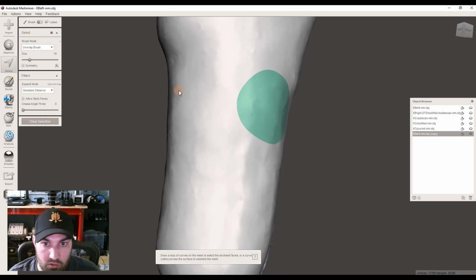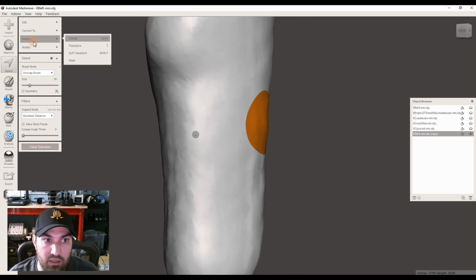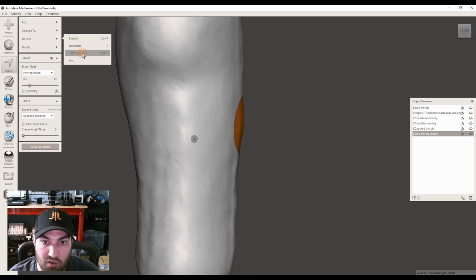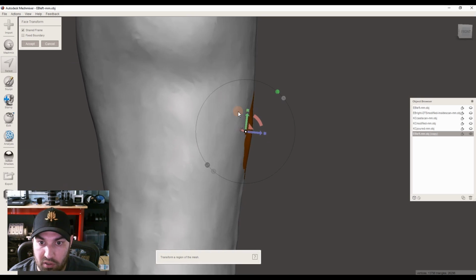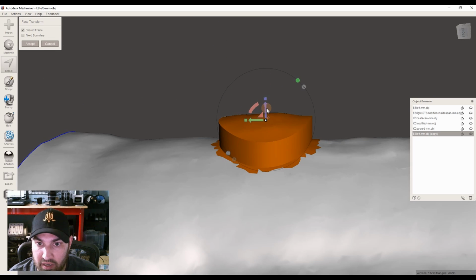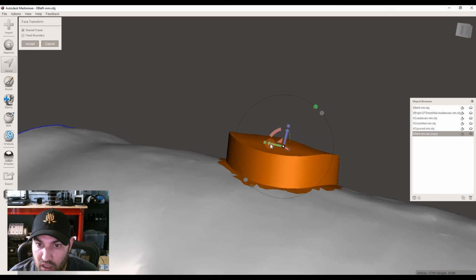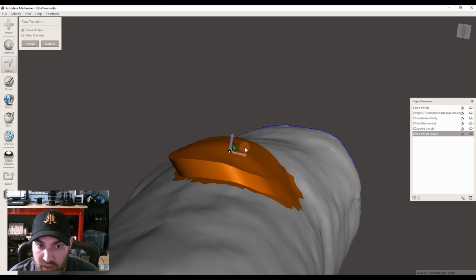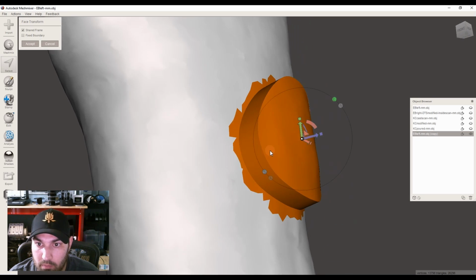is what's called soft transform. So if we select that area, deform, and soft transform, that's going to be, well, let me show you transform first. So transform is basically like an extrusion without any sort of measurement to it. So you can pull it. What you can do though is have more control of your angles, whereas an extrusion is based on your axes or your normal or constant.